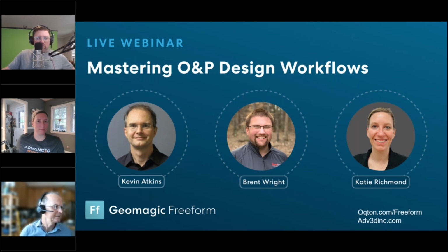So one question here. Yeah, go ahead. Oh, sorry, go ahead. I was just going to read. So I saw this question for Brent when he was smoothing the entire handpiece. It says, when he was smoothing the entire handpiece to remove lumps and bumps, some of the finger features also lose material during the smoothing process. How to secure some critical features, fingers in this case, while performing any smoothing operations?